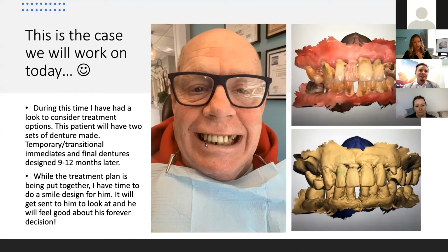So, Mr. Parsons, here we go. This is his scenario. This is what he's been living with forever. We actually just finished his case, full upper and full lower immediates, obviously. So this is the case that we're going to smile design. You can see this is what I did for him. He was like, wow, this is incredible. I didn't know that my smile could look like this. And it was very predictable.